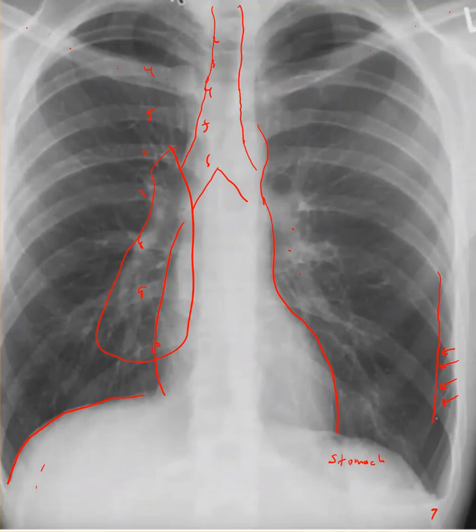And we lose it in that rib, but I'm sure it probably goes like this. And you can also see a line up here, and then it gets caught behind those ribs, but I'm sure it probably comes like this as well, and probably goes up like that. So we found our pneumothorax, and it's a fairly good size. All this is pneumothorax, goes all the way down. And remember, this is on inspiration.